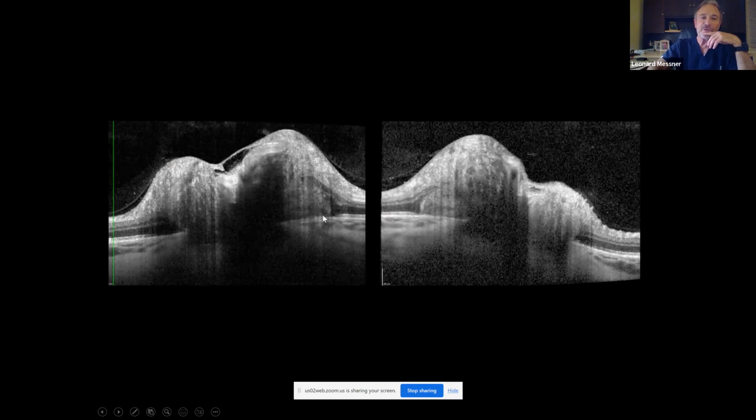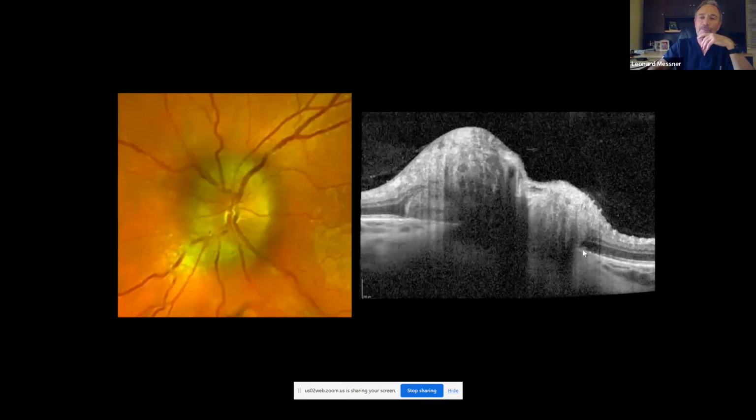We also see this inward deflection of the RPE Bruch's complex going in the right eye, also going in the left eye. But if I blow up the left eye for you, what I want to point out are these peripapillary wrinkles that you can see here, designated by the arrow on the temporal side of the optic nerve. Now, these peripapillary wrinkles, you see this almost universally among individuals with papilledema. But you also see it with other conditions that swell the optic nerve.